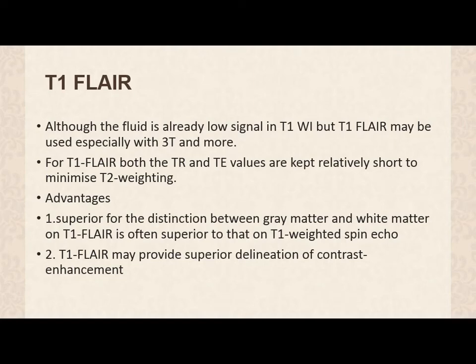There is something called T1 FLAIR. Someone might ask, on T1 the fluid is dark, so why do I do FLAIR? The idea of FLAIR is to make the CSF hypointense. There is a sequence where any kind of signal from the CSF is removed, even on T1. And this will provide superior delineation of contrast enhancement.